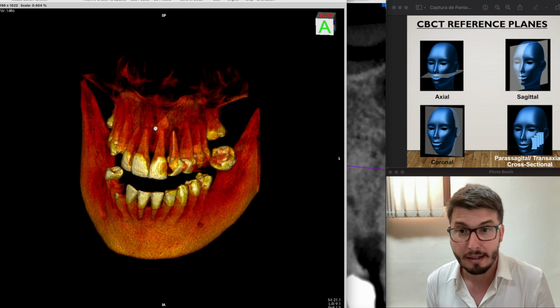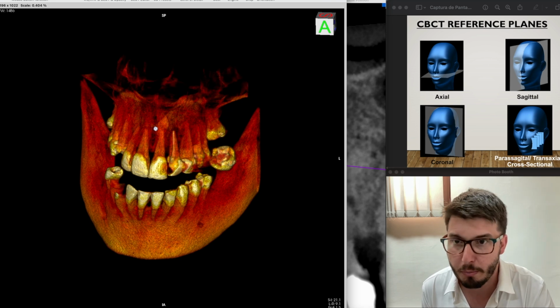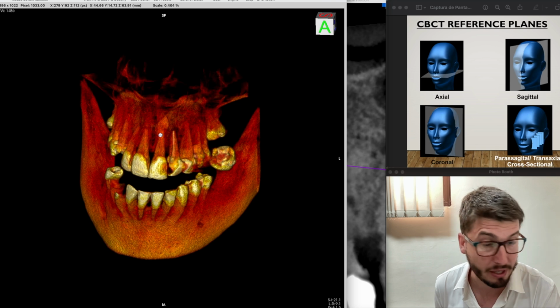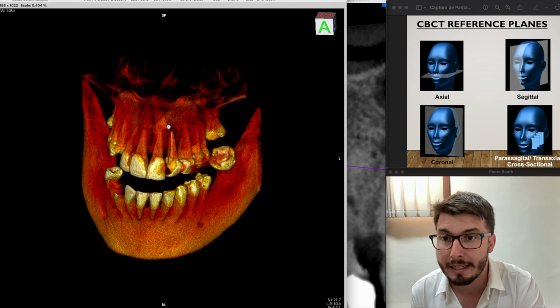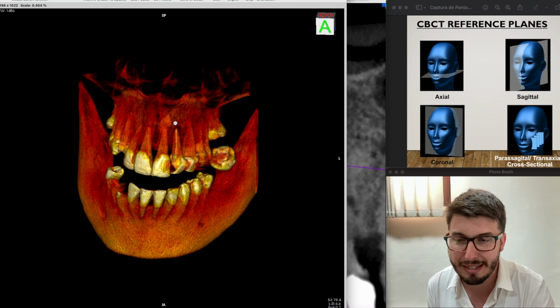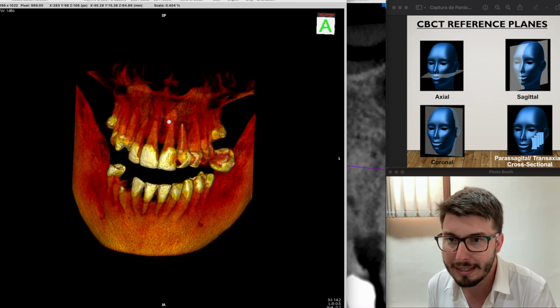So it's on top of the others, so it's adding on top of the others. It's actually something extra, okay, for this dental arch. It's ectopic, of course, the location is not common. It's already displaced with the crown turned upwards, as you guys could see, and that's the situation.